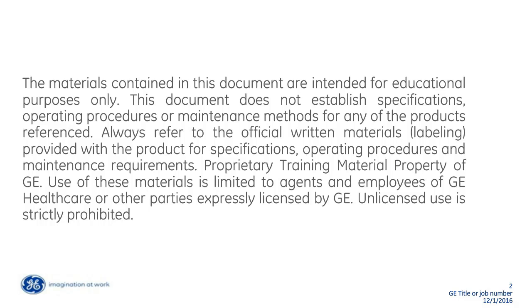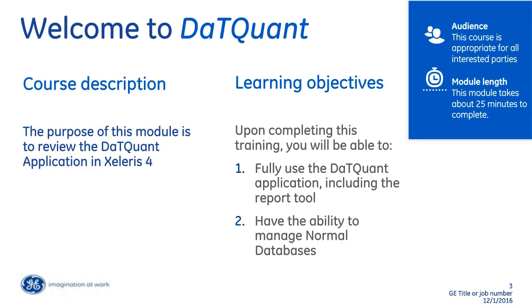Okay, so the primary focus of today's session is to demonstrate how the DaTQuant application works on Xeleris 4. We're going to look at the report tool, and we'll look at normal database management. And I anticipate the session will last around 20 to 25 minutes. And we'll leave a few minutes at the end for questions, so feel free to ask.